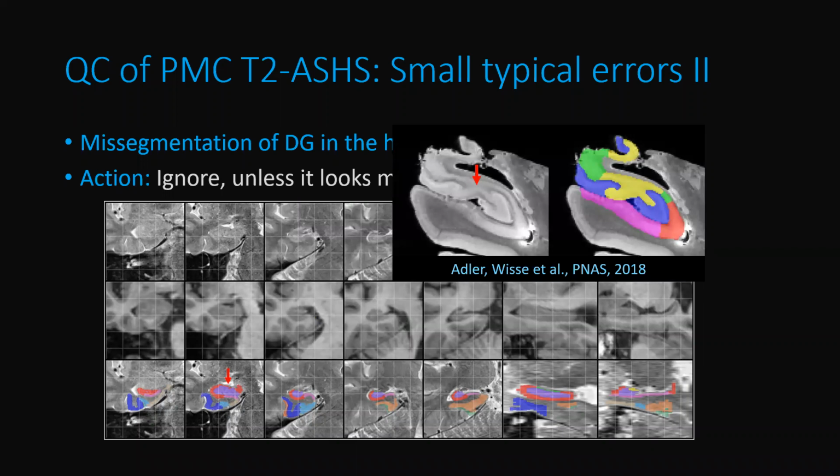And I think one of the reasons why this happens is at this point, if you check post-mortem imaging, there's actually an interruption of the dark band. Normally it's connected, but here there's actually gray matter in between. So CA3 lower in the dentate gyrus is then connected with the top part.